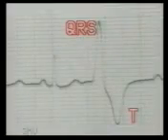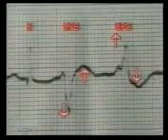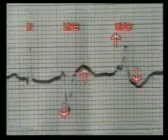This is a ventricular premature beat. Note the wide QRS complex and inverted T wave. In this strip, we see multifocal ventricular premature beats. The first beat is normal and the second and third beats are ventricular premature beats. Note that the T wave is opposite to the direction of the main QRS complex.